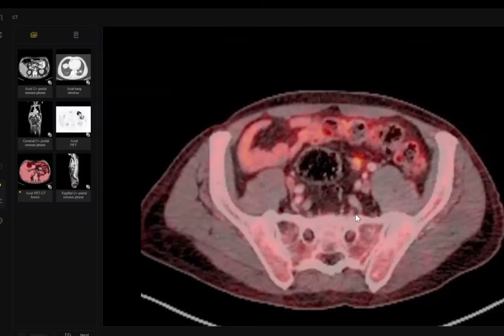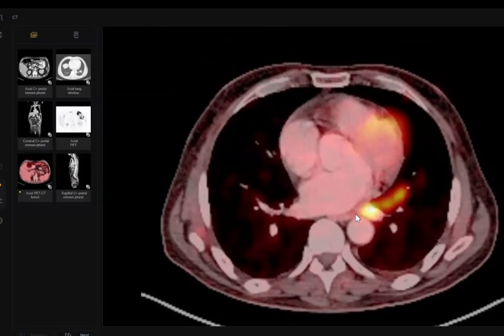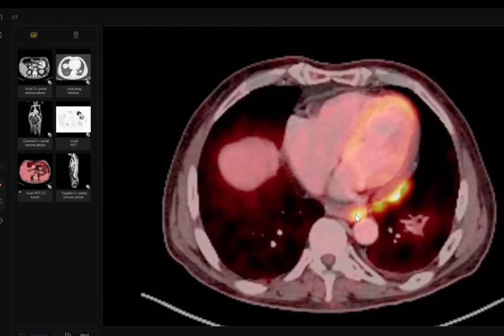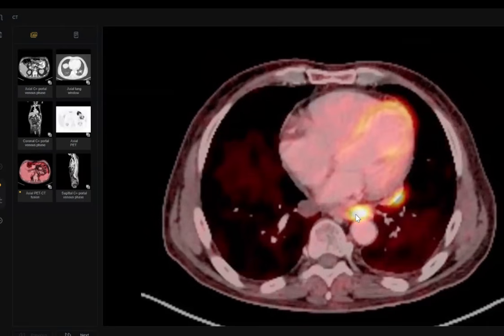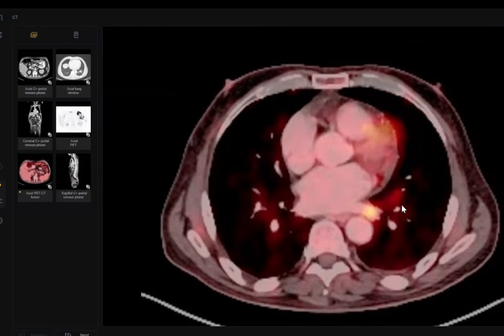This is a typical long reporting case. My colleagues adore bringing a case like I told you in the last session, the main pathology in the abdomen, but the key is in the upper cuts of the chest. Look here, my colleagues: paramediastinal mass and pericardial mets.